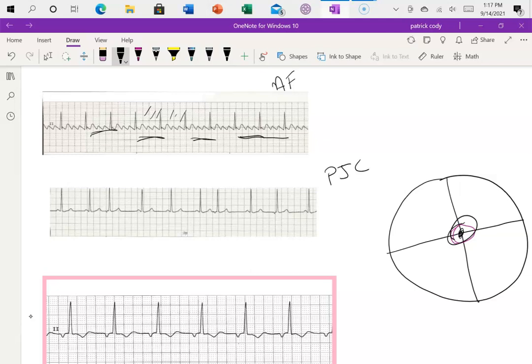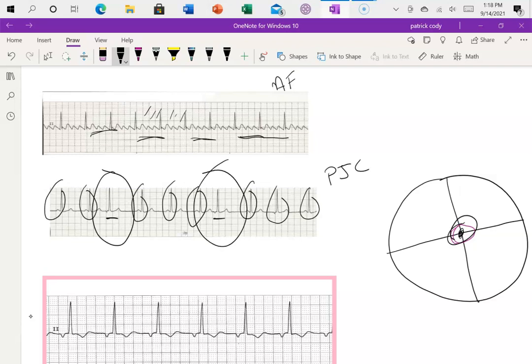And so here as we look through this, you notice that we have what would normally look like a sinus rhythm, right? Sinus, sinus, something weird here, sinus, sinus, sinus, something weird here, sinus, sinus, sinus. So this meets all the criteria for a sinus rhythm, right? We have a normal rate, excluding the ones I underlined. We have a normal rhythm, but then we have this irregularity caused by some premature beats, and then we have the P before every one of our normal QRSs and a QRS after every one of our Ps. So the underlying rhythm here is in fact sinus, but then we have these premature beats here and here, and we've got to figure out what to do with those.